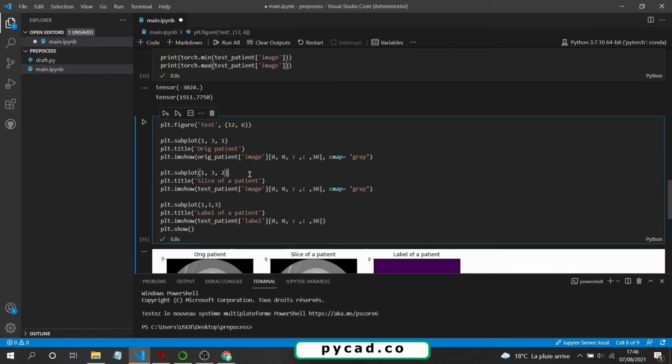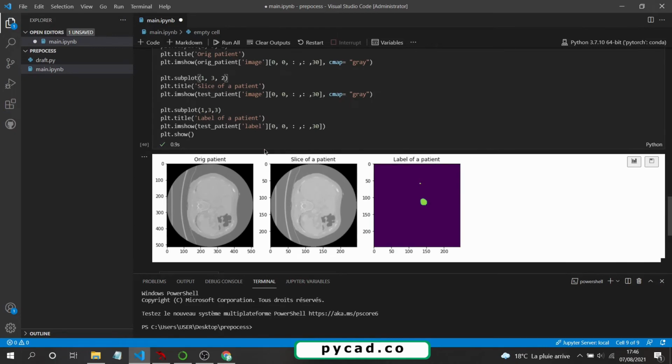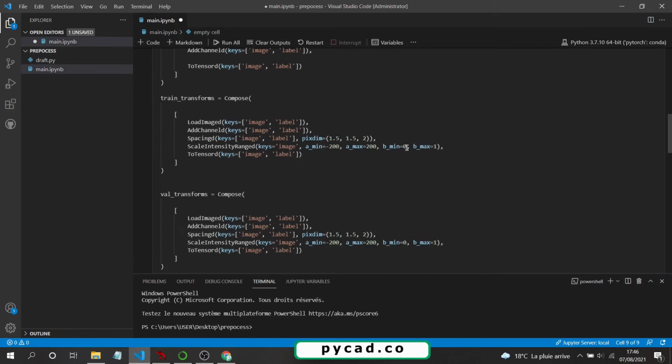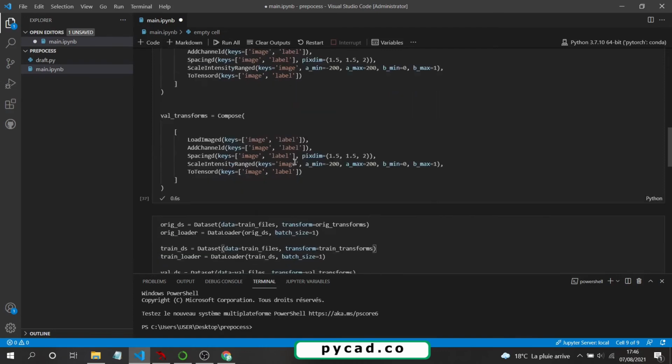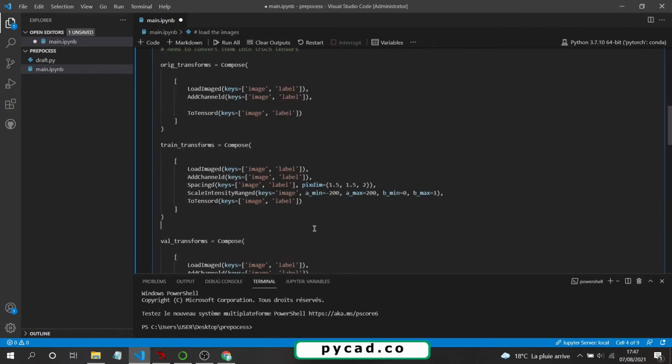In our Python repository, we are not seeing the difference. Why? There is something missing. A min, A max, B min, B max. The original files, 3D. Yeah, here I forgot one parameter, another parameter, sorry about that. And here you have to put them as float, so 0.0 and 1.0, and the same thing here.